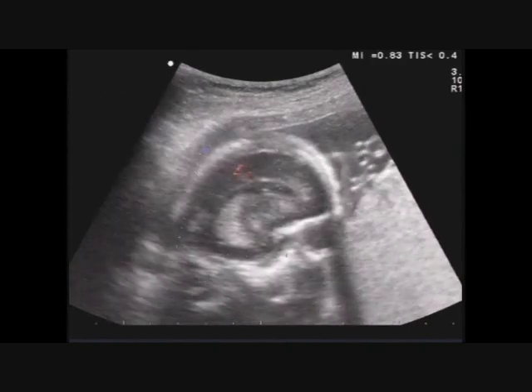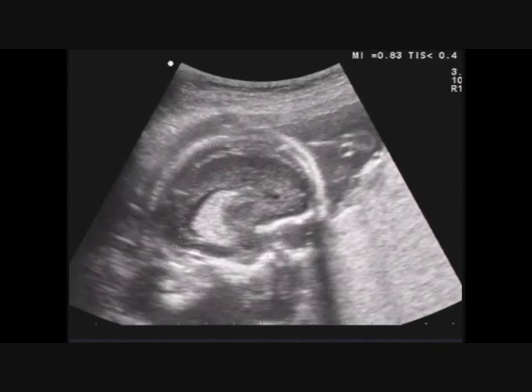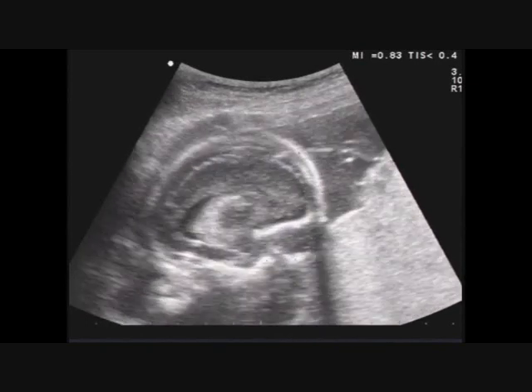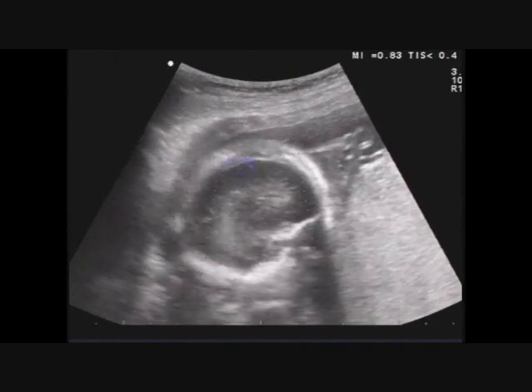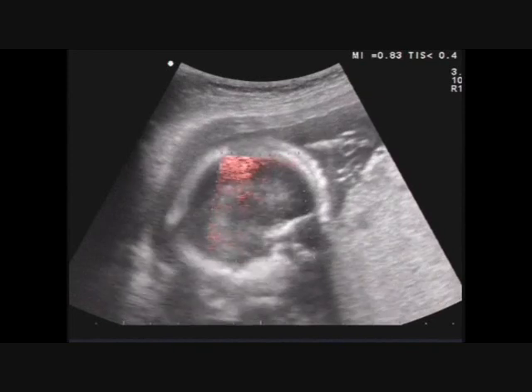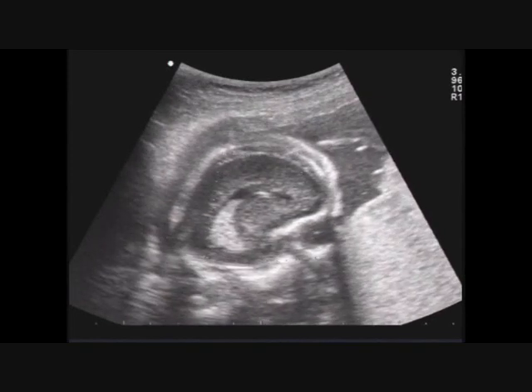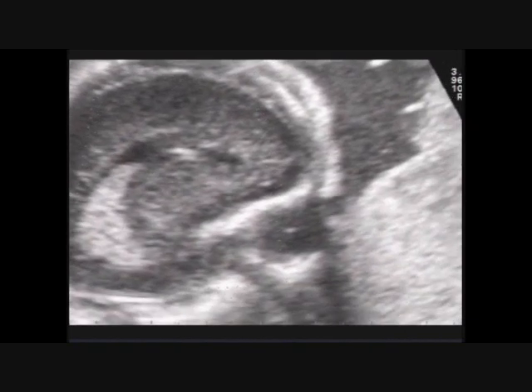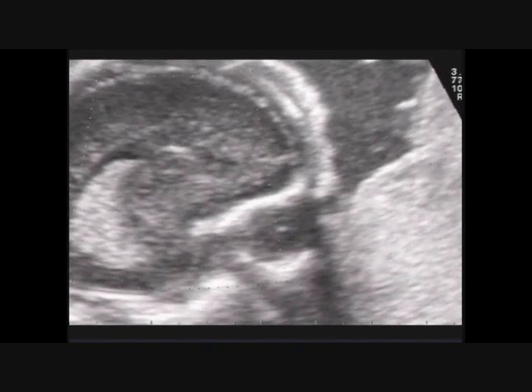You need to do a careful study and observe all the fetal anatomy, and why? Because in half of the cases there aren't associated anomalies, in the other half there are associated anomalies, and then it could be part of a syndrome, as for example Aicardi syndrome, but there are many other syndromes where the principal sign is corpus callosum agenesis associated with other anomalies.